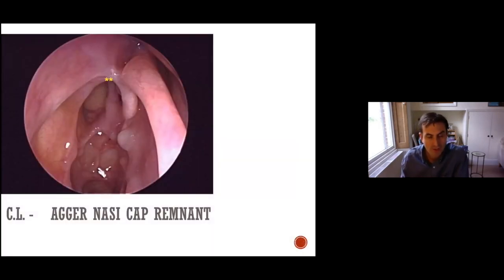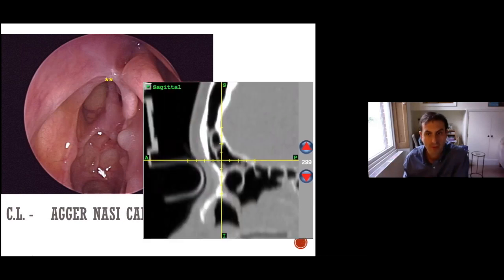So it's an important structure to remove because, as you can see in this example where it's left behind, not removing it properly may lead to continued obstruction of the outflow of the frontal sinus. And there you can see it nicely. So Stamberger described this as removing the egg, uncapping the egg, sorry, was the phrase he used. So this is the eggshell upturned that you need to uncap.